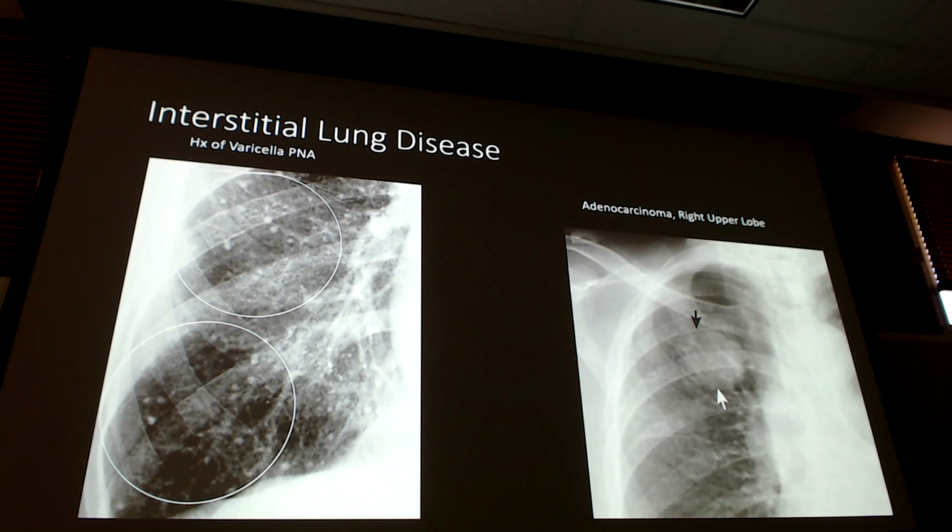If it's just the nodules a lot of the time, we're concerned that it's probably a metastasis like we talked about just last slide. Here's a big old adenocarcinoma, this big old circular mass bordered by the black and white arrows. How do I know it's adenocarcinoma? We'll learn that in a later lecture. Symptoms and location. Okay, there's the most common area of these lung cancers and kind of where they can present, and we'll talk about that.